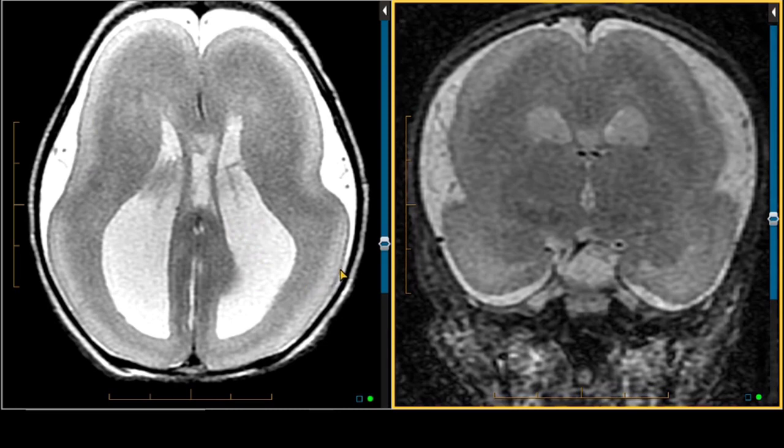Within that, we're seeing enlargement of both lateral ventricles, more pronounced posteriorly. On the brain, we're actually seeing something that we saw on the other cases. We saw the peripheral cortex. We see a cell sparse zone that's bright on T2 weighted imaging. And then we see what is a band of gray matter-like substance called gray matter heterotopia. So this is a very severe case of lissencephaly with band-type heterotopia.